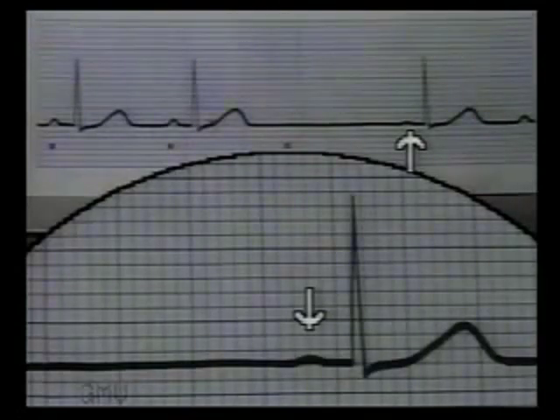This ECG shows a pause with a preceding normal sinus beat and normal T wave. The escape beat shows a slightly altered P wave and normal QRS complex. So this is a sinus arrest with atrial escape beat. Note the slightly altered P wave of the atrial escape beat.